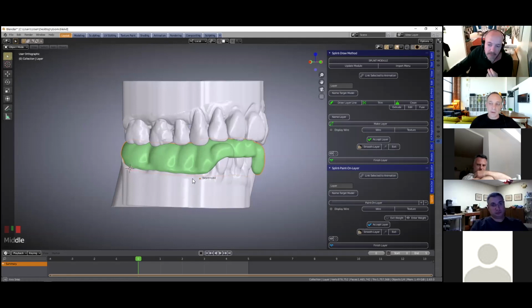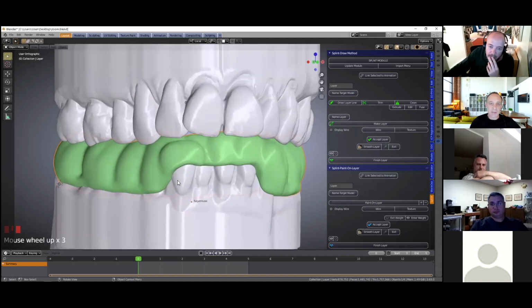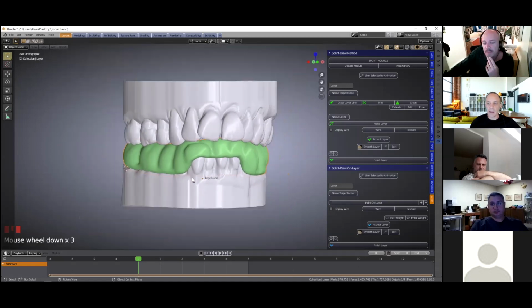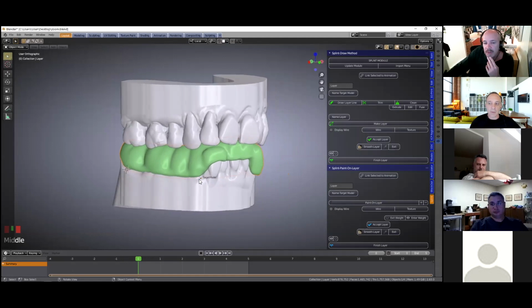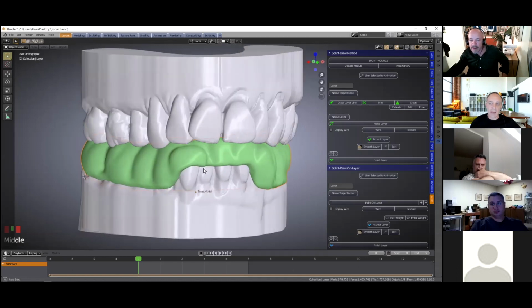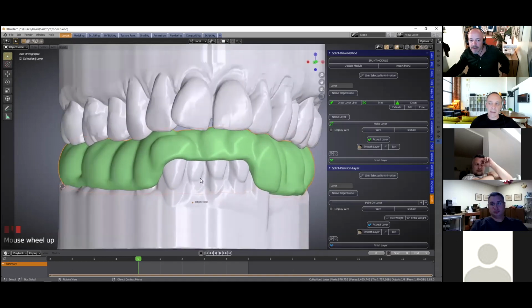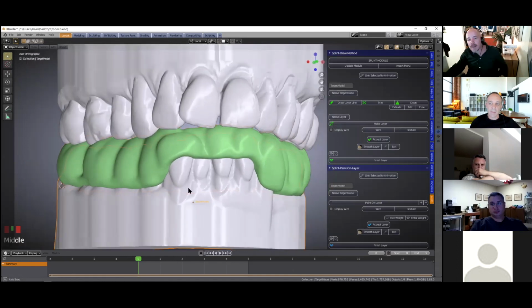Yeah, that's a good question. I mean, what do we do? We've made splints where you've got absolutely no undercuts. So do we use the patch up tool in the model designer, or cut a sphere, like an Adams crib, where we can actually remove some of the gum interproximally to hypothetically create a bit of a clipping mechanism?